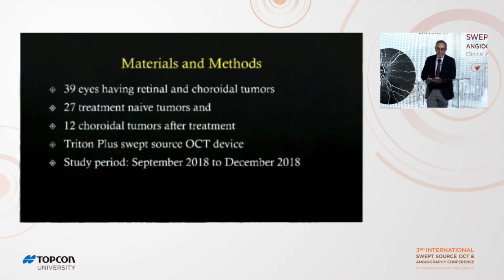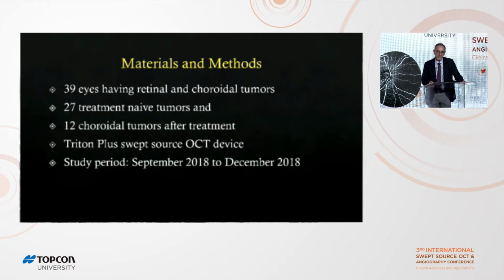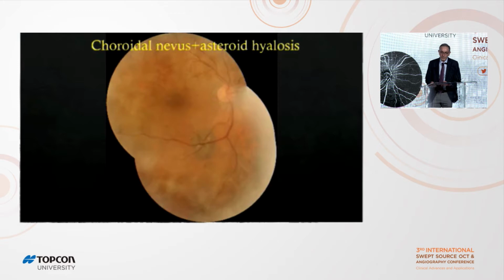So I studied 39 eyes having retinal and choroidal tumors. 27 patients had treatment-naive tumors and 12 had choroidal tumors after treatment. And all the studies were performed using the Triton Plus Swept Source OCT device. I would like to show you some examples now.